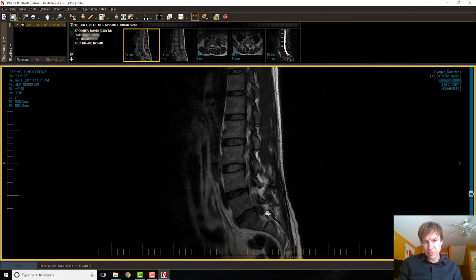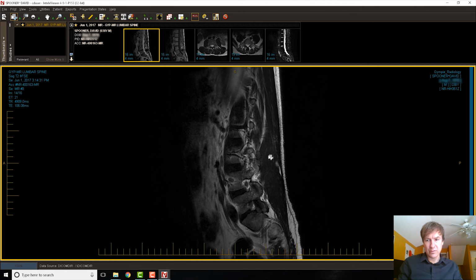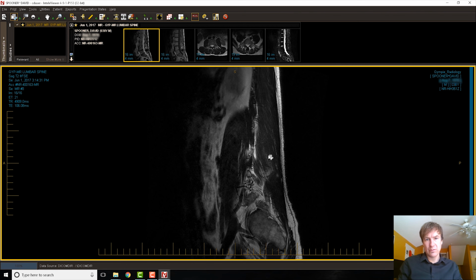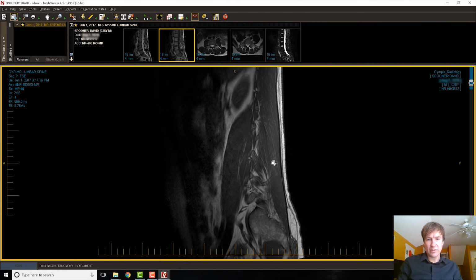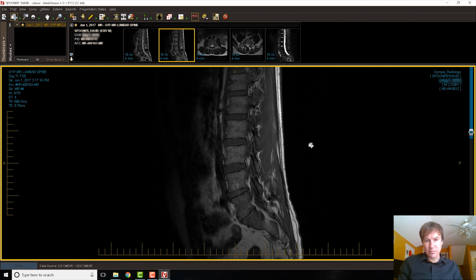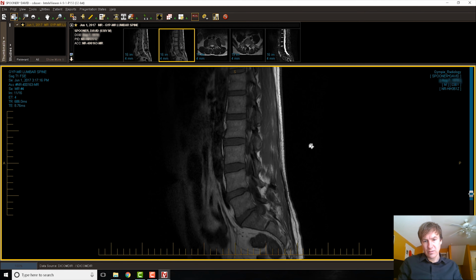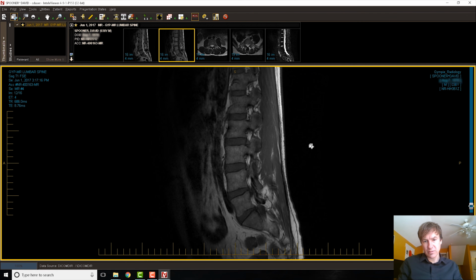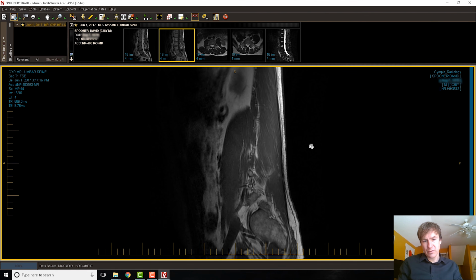So here's that bulge. You can see it pretty well there. It's not a bulge, sorry, it's a one wall herniation. So, cycle through. The written reports do seem to be a little bit different, but it's probably just because there's 2 different radiologists looking at them.